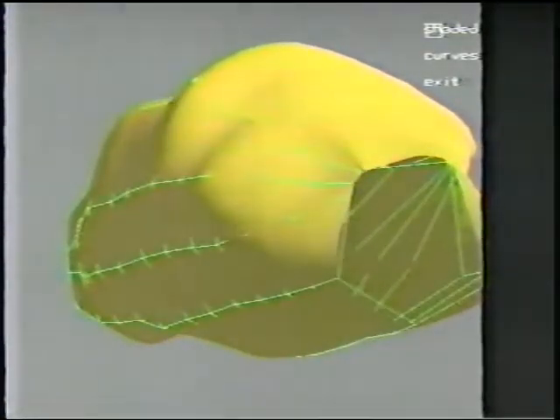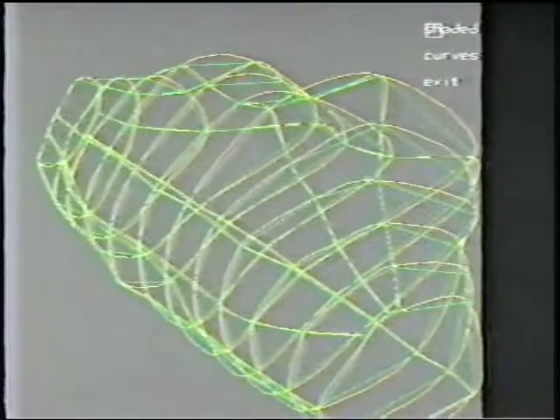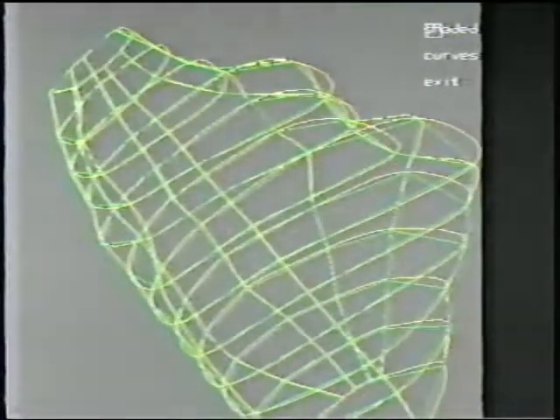So the original data only consisted of what you see here outlined in green. That is, the few grid points happen to be 8 grid points per slice and 12 slices. But the surface is reconstructed using a smoothing algorithm, a spline smoothing algorithm, all calculated locally in the Adage 3000, including the rotations.